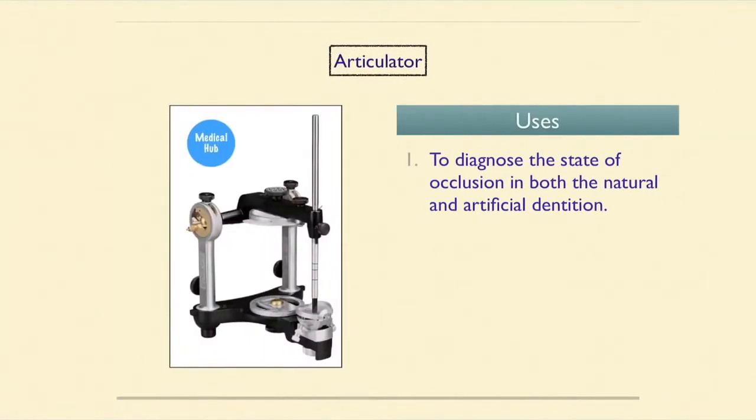Next is articulator. It is used to diagnose the state of occlusion in both the natural and artificial dentition.